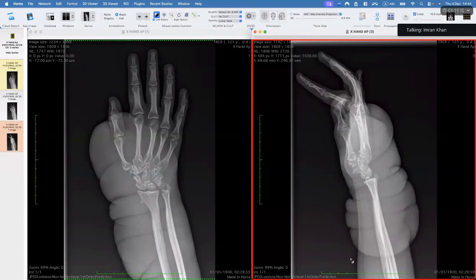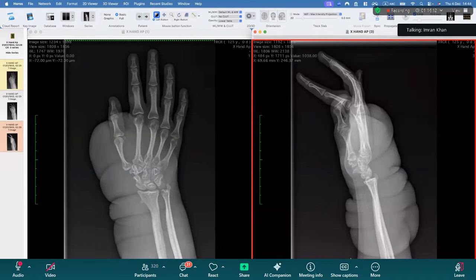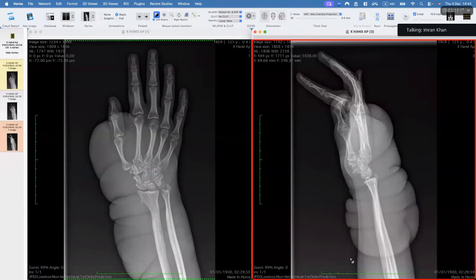If you have lymphedema from breast cancer, you would have to have it for months and years to cause this degree of scalloping. Is that correct? Yes. That's a lot of scalloping, isn't it? So it's unlikely to have breast cancer causing lymph obstruction, causing just a selective part. Anyway, let's move on.